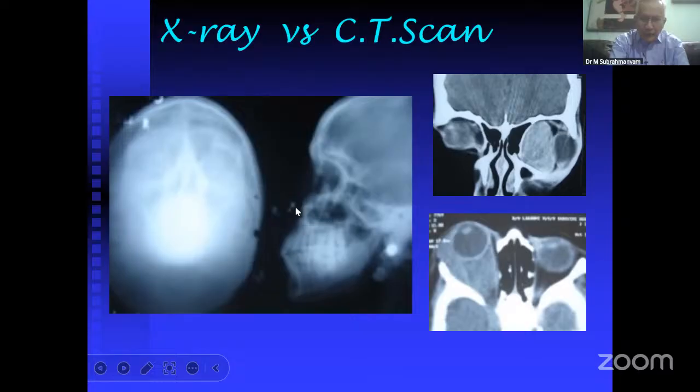Because I can see this is probably a nose stud and an ear stud. Ear studs are also used by males nowadays, but I think males do not use the nose stud. That's why I think it's a female X-ray. And also, if you look at the bones, it's a single row, so an adult female X-ray. Nothing more I can draw from this, nothing about the orbit or the tissues or anything.